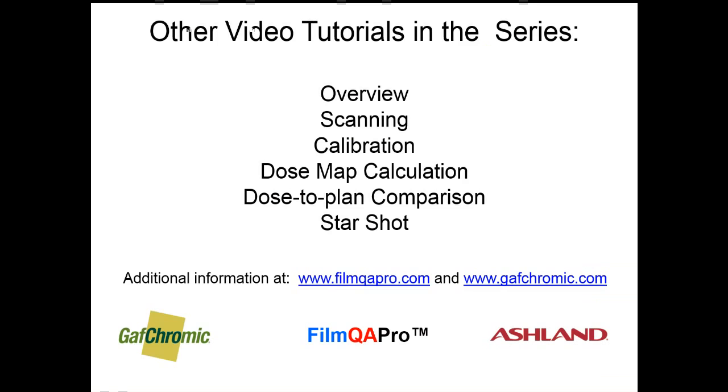This concludes the tutorial, but to get help in scanner settings and film placement on the scanner, refer to the tutorial module on film scanning.